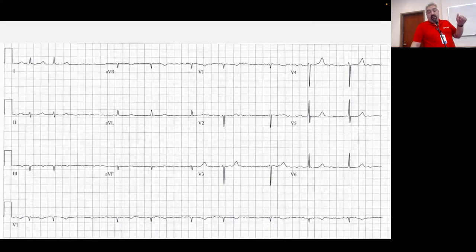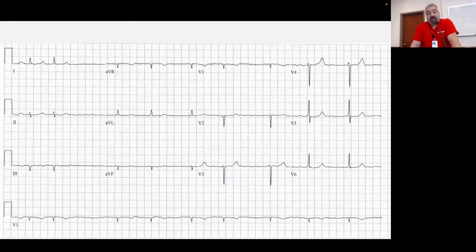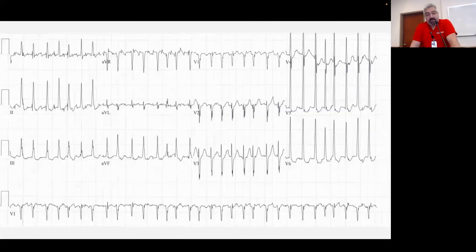Whereas in here, there's so much atrial activity firing that it almost comes out to be a flat line, because they're just firing constantly. Each time one of those foci in the atria fires, it's creating a P wave. But think of them as all stacking on top of each other. If you stack a bunch of P waves next to each other, you get this very fine little burr, burr, burr, as you're going over all the bumps. So that's a fine AFib.